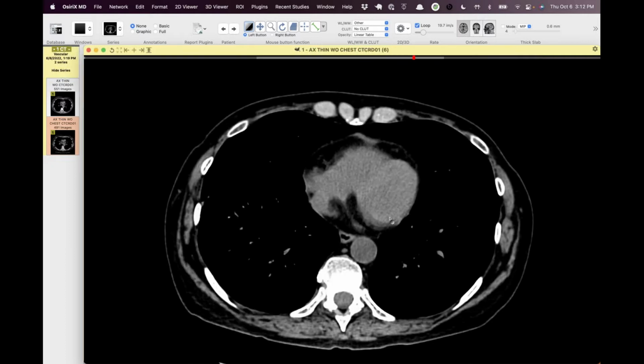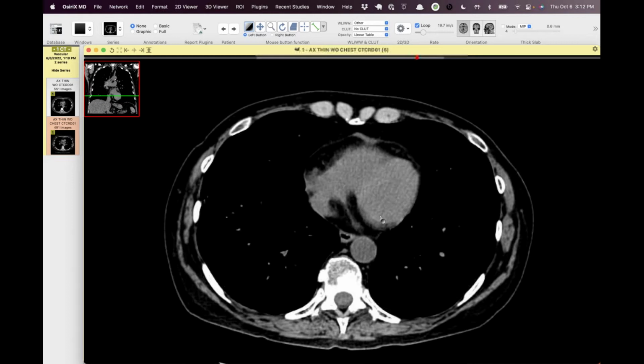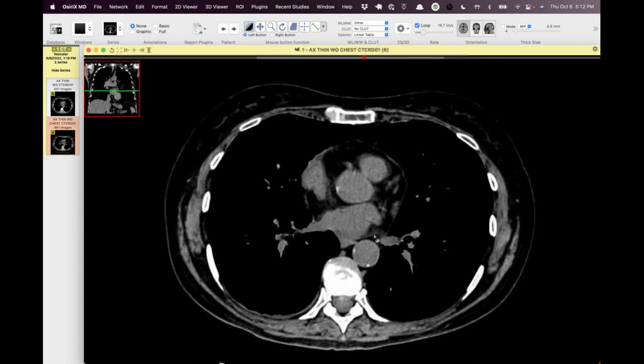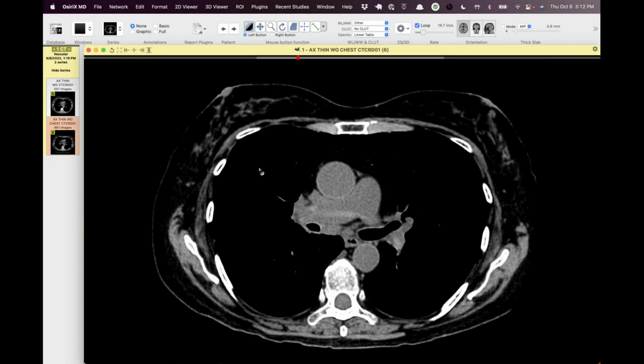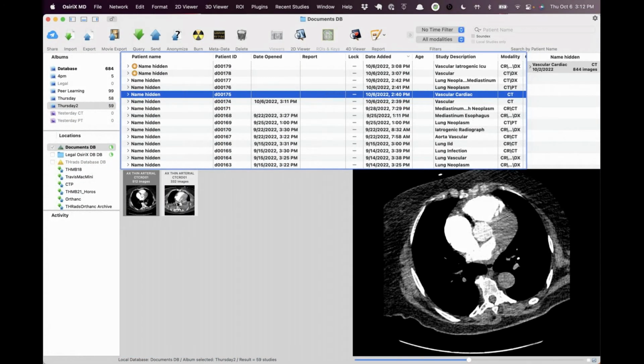And I was going down to the heart. You could see they're probably a little anemic, and you can see the septum there, so that might help bring out the non-con PE, but this is something we occasionally see and can be looked for in the right setting.